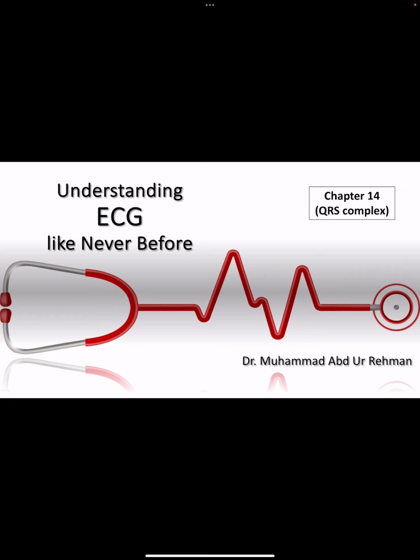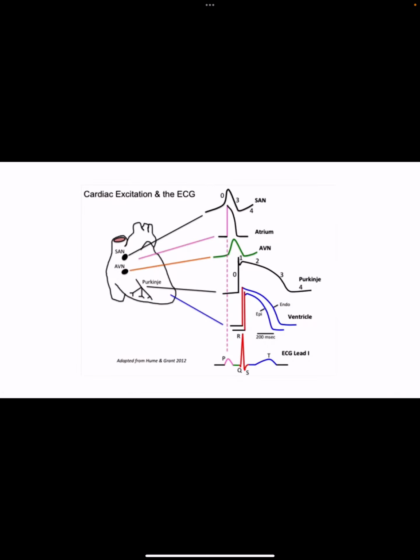In this video, we will read about QRS complex, and we know that QRS complex demonstrates ventricular depolarization in an ECG. Let's go back to our original photo, which we have been discussing for a long period of time. So I will go through some of the basics of ECG quickly before reaching QRS complex in detail.